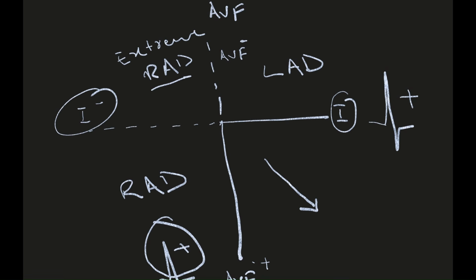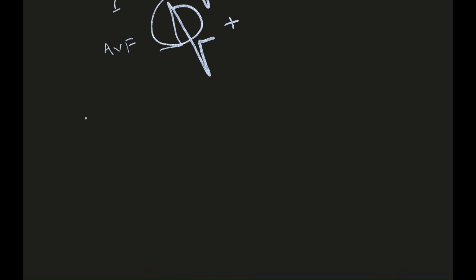Now, what if the patient is having left axis deviation. This is the region of left axis deviation. Let me draw it again for you. In left axis deviation, if I'll draw the leads again, lead 1, AVF, I have told you that this region is your left axis deviation. If you recall your basics of mathematics, lead 1 is positive over here.